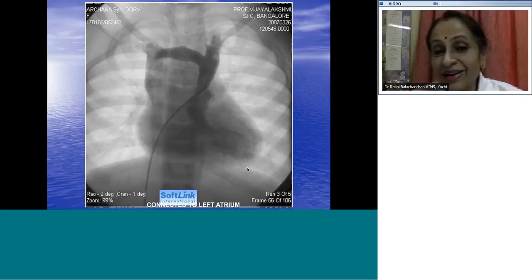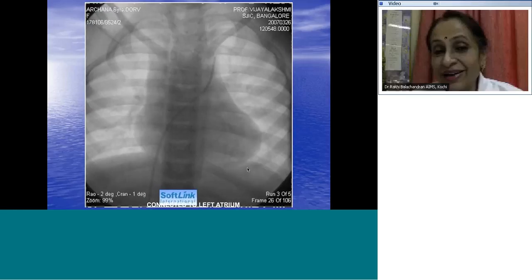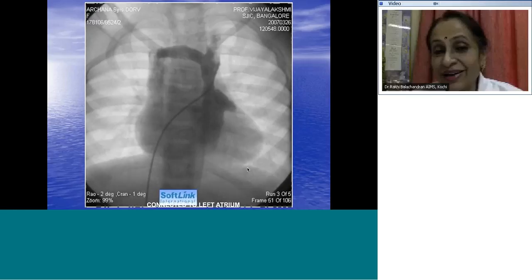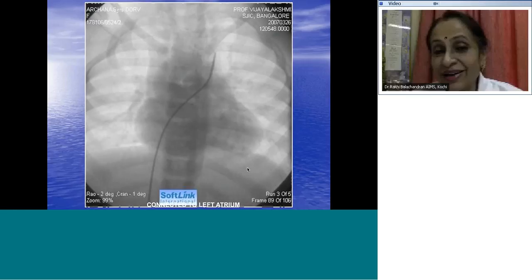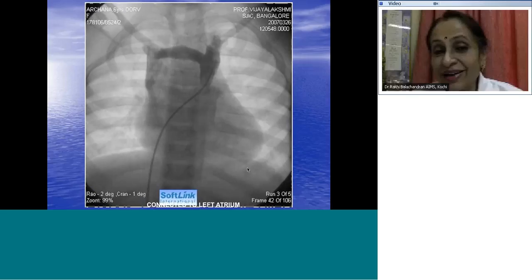TAPVC is not a right answer. Supracardiac TAPVC is also not a right answer.